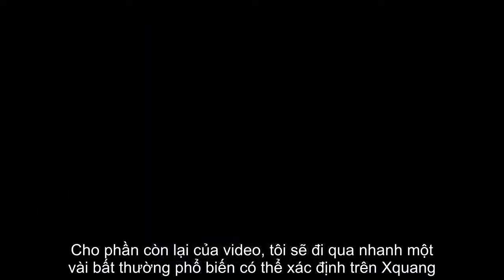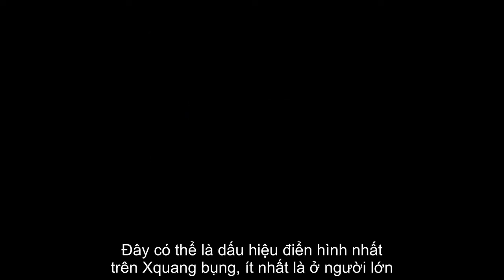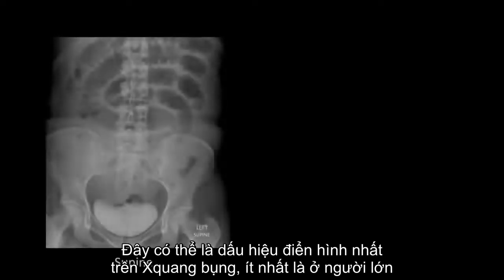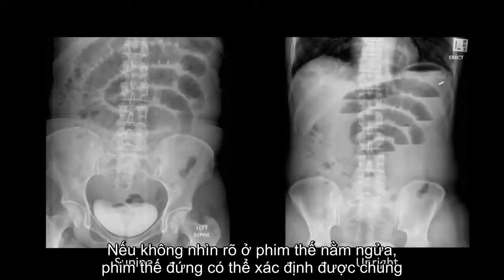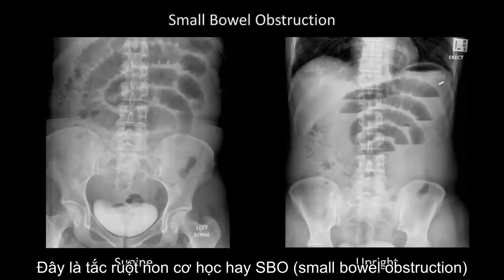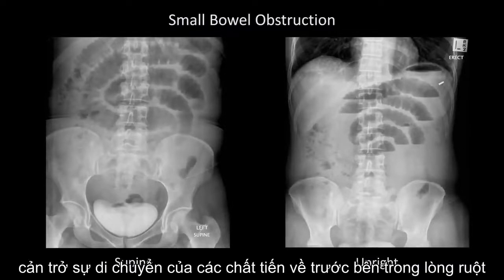For the remainder of the video, I'll run through some common abnormalities identifiable on X-ray. Here is probably the most classic abdominal X-ray finding, at least in adults. If not apparent from the supine film, the upright film may give it away. This is a mechanical small bowel obstruction, or SBO, caused by a physical anatomic obstruction to the movement of intraluminal contents forward through the bowel.